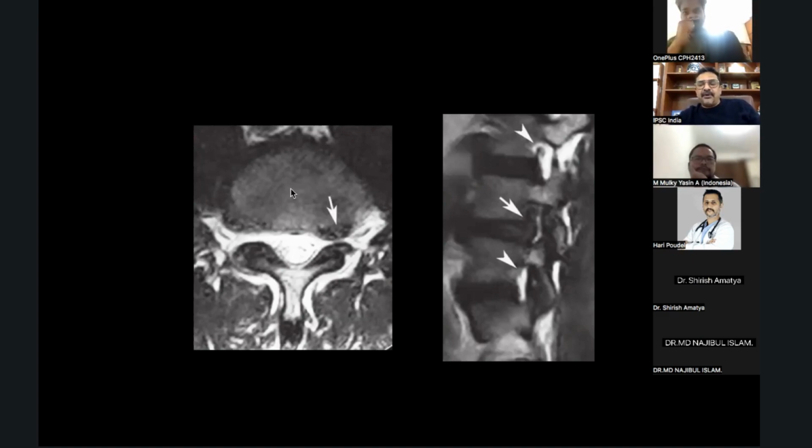But it is very important for us to understand where the herniation is, what kind of herniation it is, whether it has migrated upward or downwards, and accordingly we should select our trajectory. So all this we'll cover during our successive sessions when we discuss the transforaminal approach and other approaches. I'm just telling you right now what all you must see there.